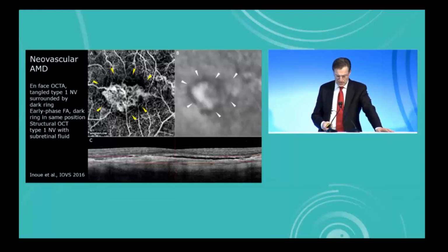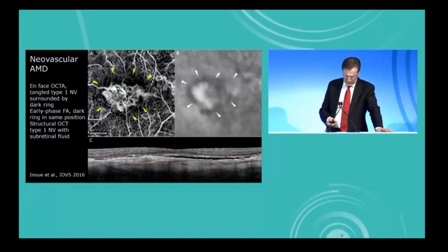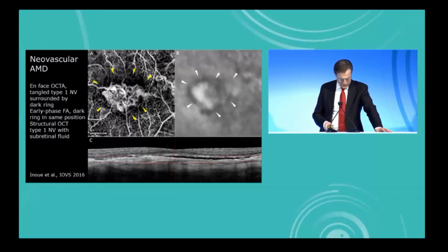And there's also a dark area here around the neovascularization on the OCTA en-face image. And the structural OCT shows subretinal fluid on top of or in front of a neovascular complex.